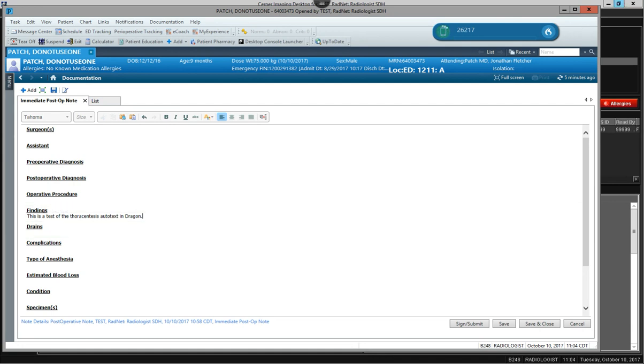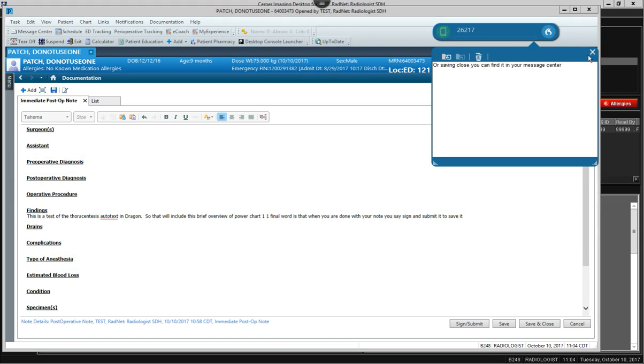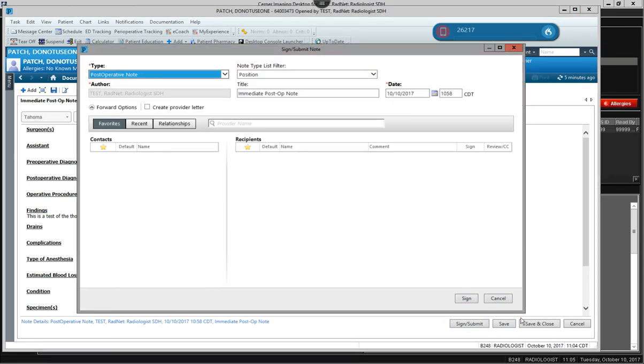So that will conclude this brief overview of Powerchart. One final word is that when you're done with your note, you say sign and submit. If you save it or save and close, you can find it in your message center. And you can see Dragon's having a little fun with me there. You'll find it in your message center, but it will not be visible to any other users of the system. So you want to say sign and submit when you're ready for this to be saved.